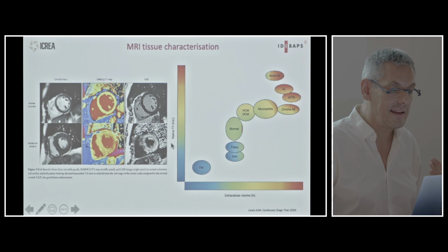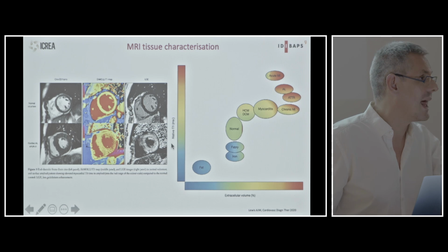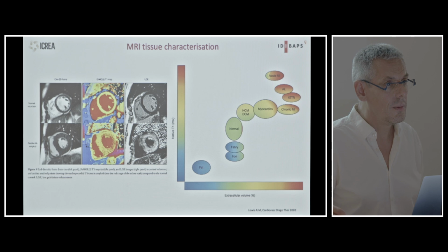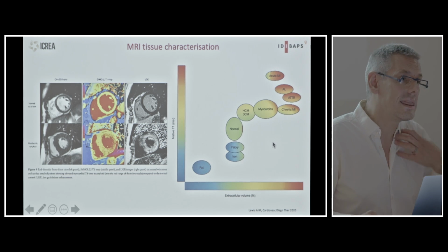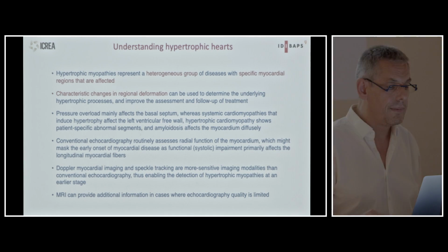And then you see that indeed, based on, for example, T1 and extracellular volume, which now some labs can do, but which is still quite tricky, I have to admit, not everybody will do it as good as the others, you could do that also. But honestly, I think looking at the patterns of the deformation, once you're trained for it, will be almost as good.